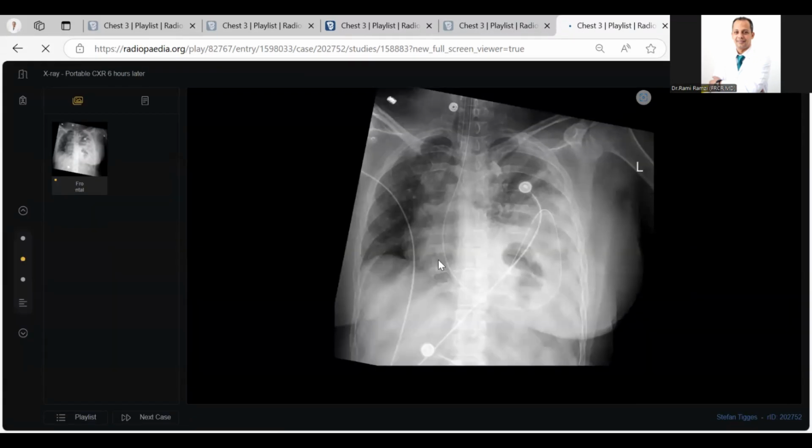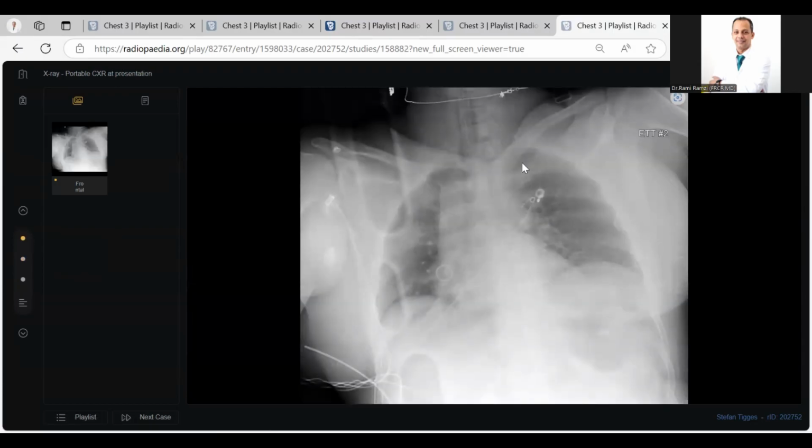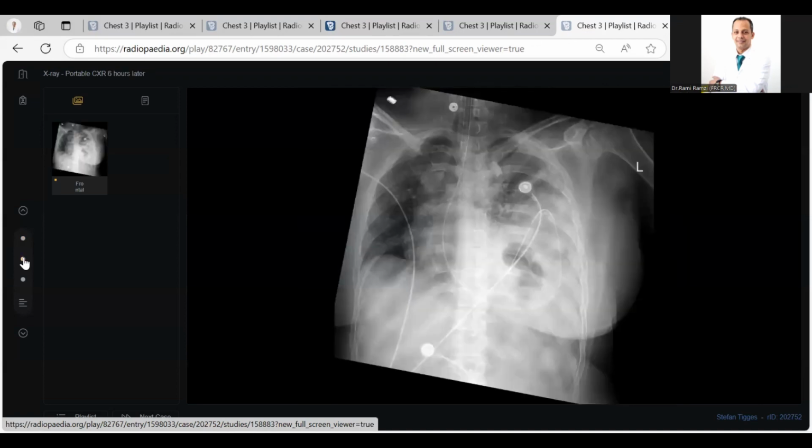Bronchoalveolar. This case is delayed diaphragmatic rupture. First X-ray is nearly normal. This is positional, shifting. Then this patient is a polytrauma. My colleague took home advice today in a polytrauma patient. Try to tell the examiner, I will examine the patient again to rule out delayed diaphragmatic rupture.